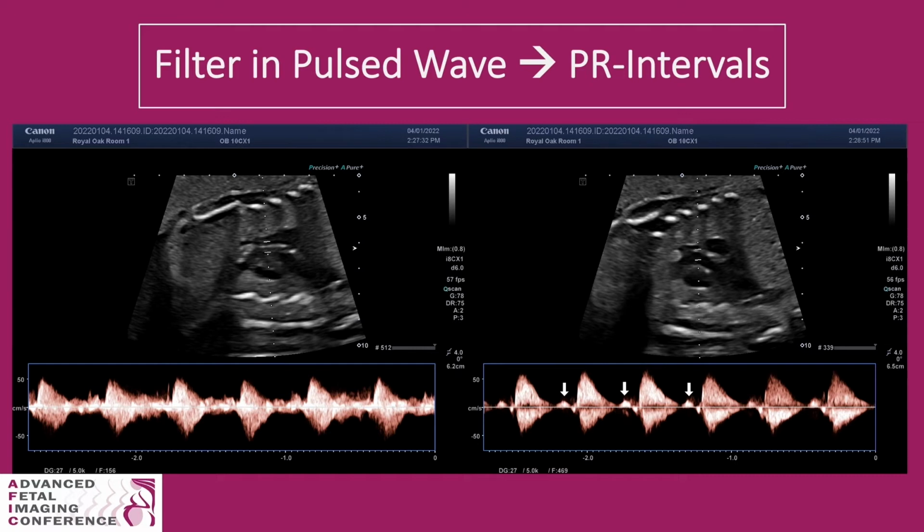So why do we use this? The image on the left does not allow us to properly see exactly where we need to take our measurement, and in this case, the measurement is time. You can see the aortic flow going above the baseline, but what isn't clear is where it starts or stops, or where the atrial contraction is. Can you pick out the waveform on the left? I'm a fetal echo tech, and I cannot.